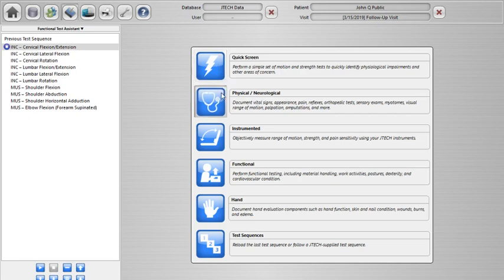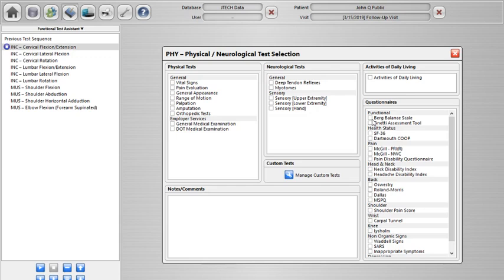But items that you need to choose from, we've still maintained the idea that on the right-hand side you simply check boxes for different things, and the left-hand side, the test sequence queue, will accept those and aggregate them. That, we heard from people, was very usable, made a lot of sense to them, so we've maintained that and stuck with that.